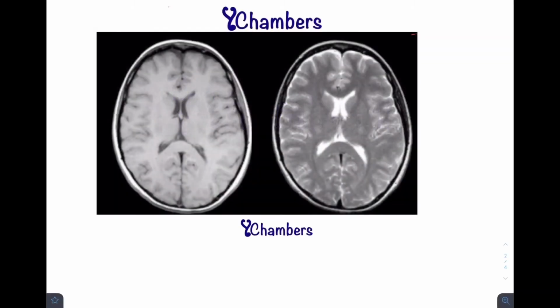Yeah, so in this video we will be talking about the fundamentals of T1 and T2 weight MRI of brain. This is the most important topic which you will be tackling in your clinical practice. So we need to first know the fundamentals and very much basics, which side of the brain is affected, which side of the brain is edematous, which side of the brain is having hydrocephalus. So this is how we can approach the MRI.